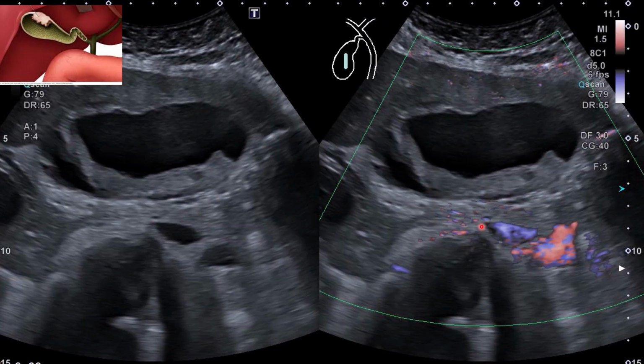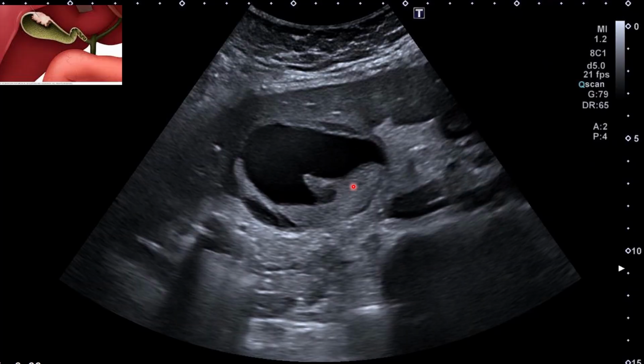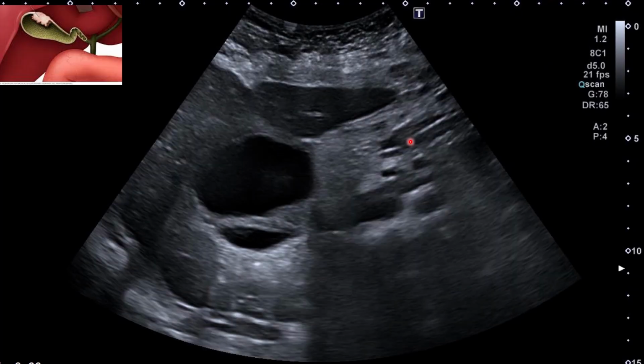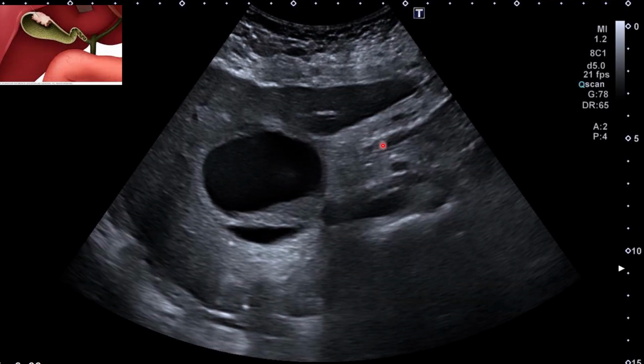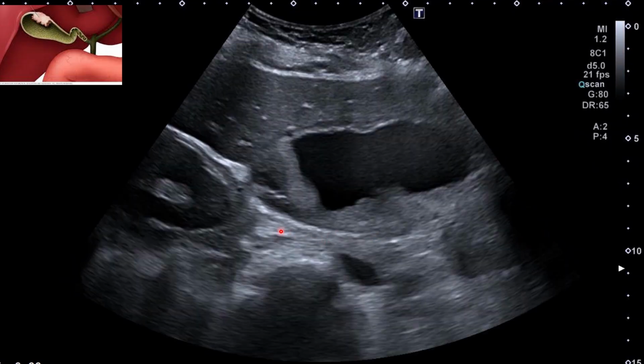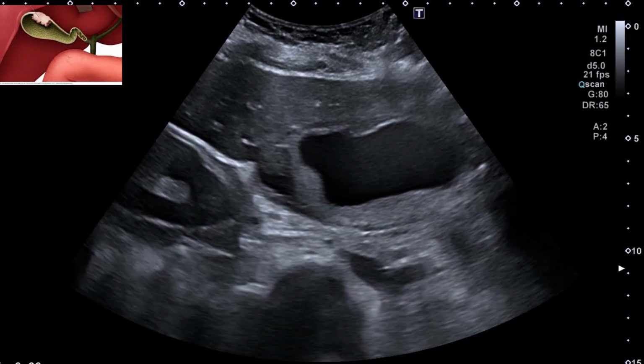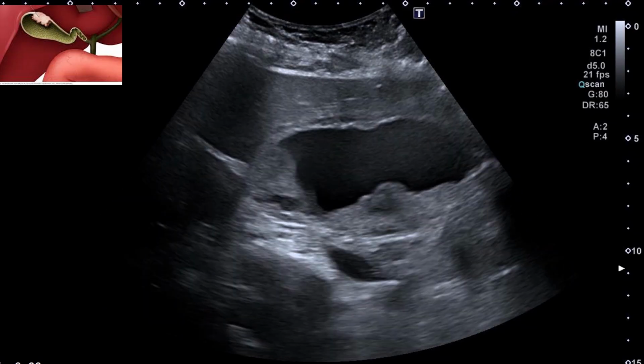But this could be classical gallbladder cancer. It could be gallbladder cancer. That's what I think. But the detachment here is the one that can also make me think that this is sludge that is appearing like a tumor, as you can see there. So I need your comments, how you take it, how you feel, how you see it. What could this be?